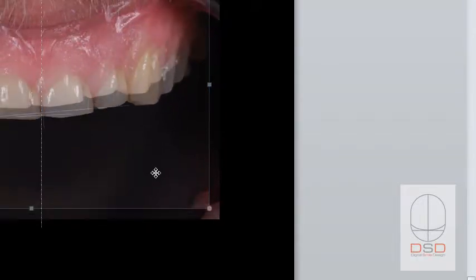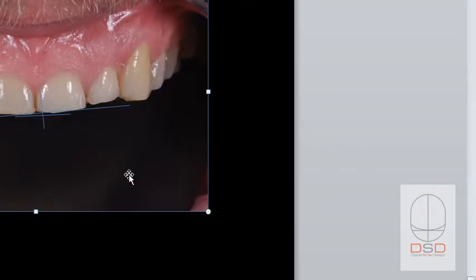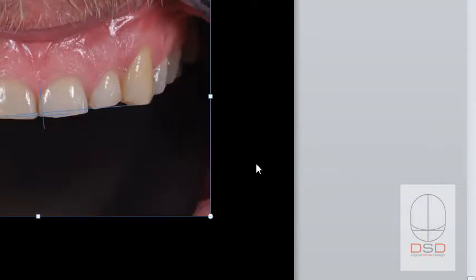You can see the tips almost there. One tip is here, the other one is a little bit far away, so I have to reduce this a little bit more and then replace it. And I think this is very nice. Once I do this, I don't pay attention to the second and third line. I just pay attention to canine to canine.